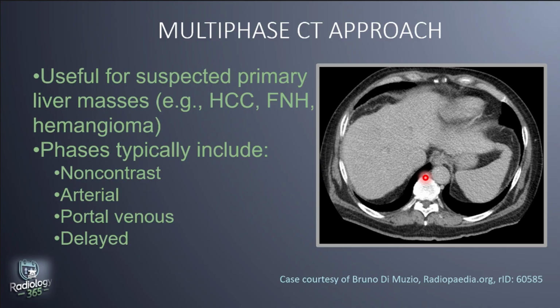So we can see in this image that the portal vein, the hepatic vein, the IVC, even the abdominal aorta don't appear that opacified. This was a delayed phase after the contrast had washed out of the vasculature significantly.